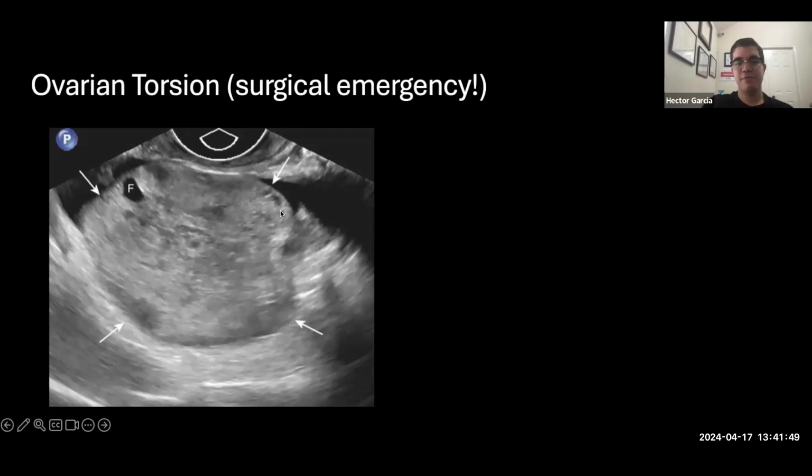And this is what I was describing earlier, a dermoid cyst that caused the ovary to undergo torsion. And this is extremely painful in a female. It's like a young female. In an exam, the way I've seen it, she's doing yoga or studying, and then she has this sudden pain in the abdomen. Ovarian torsion is one of the top ones, and they usually try to confuse you with acute appendicitis or ectopic pregnancy. That's the differential diagnosis for this.